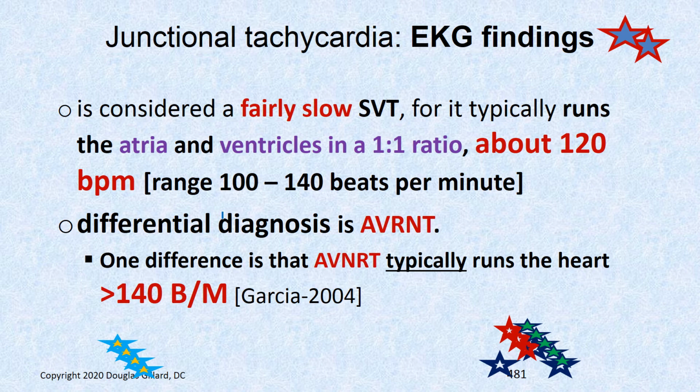There's another one I hope to get to by Monday. If I don't, I do have YouTube videos of AV NRT up that you can watch. But I want to get to AV NRT if possible. This is the most common cause of supraventricular tachycardia, and it looks really similar to a junctional tachycardia. These guys are twins, and that's the only reason I'm keeping junctional tachycardia in, because they look so much alike.